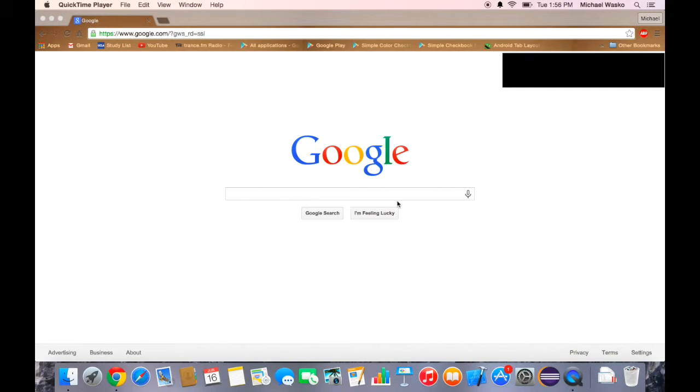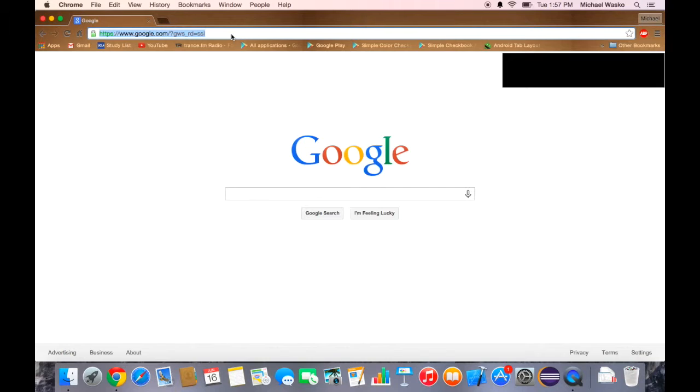All right, so before you use the sensors and the kit to collect any data from a patient, the first thing you should do is create an electronic record that allows us to keep track of that subject's data. This is for the benefit of our server so that we can distribute the data correctly. So the first thing to do is to open a web browser and go to the URL, which we will indicate right here.